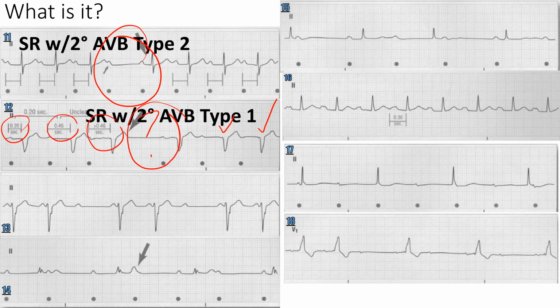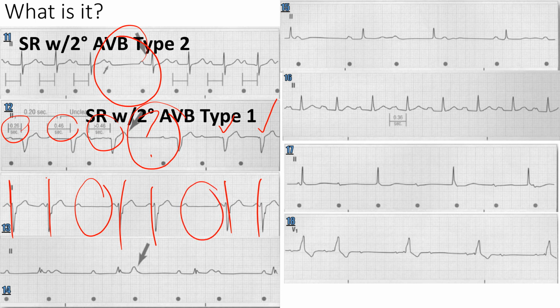All right, so number 13, what is that? That looks irregular, you just look at it and look away. That's just irregular, right? Anyways, you're going to look at it and you're going to see an irregular rhythm. I got something going on here and something going on here, right? Was it longer dropped, or was it just, ooh, drop, where'd they go? They just ghosted me. So what is that?